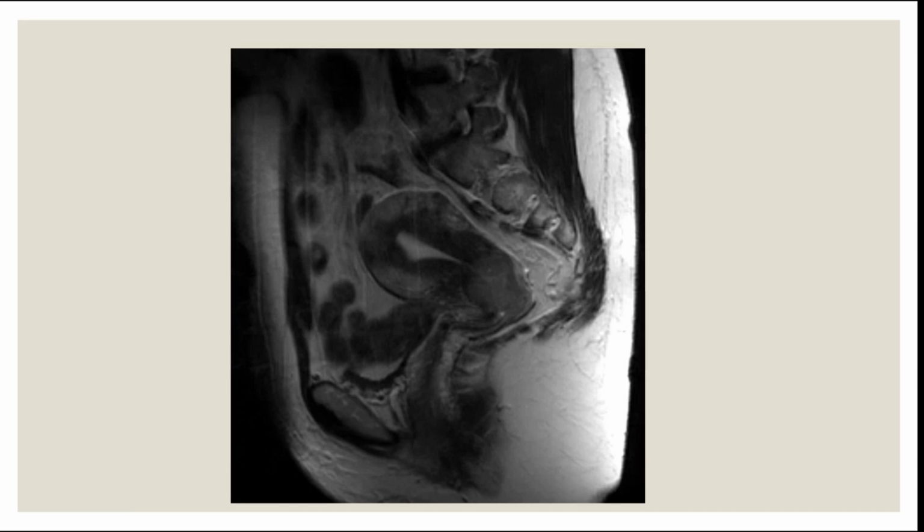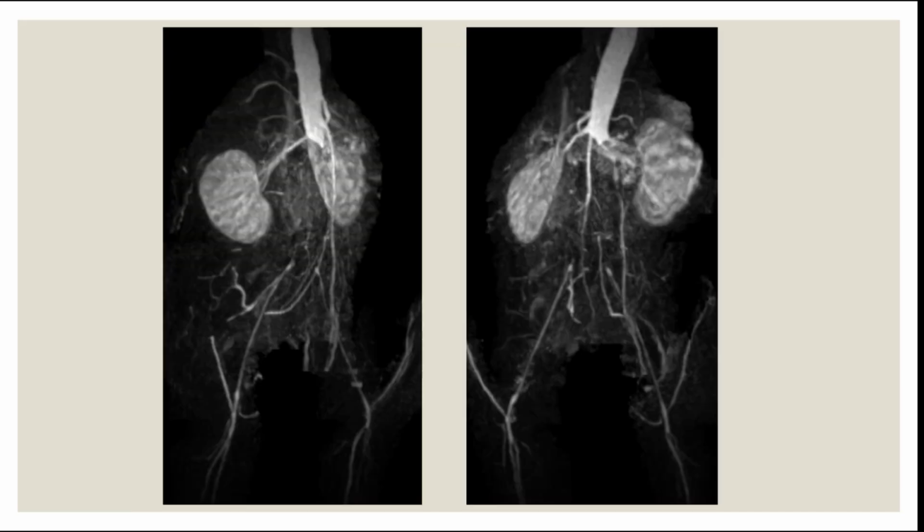I know MRIs are sometimes a bit difficult compared to the rest. So how about this one? This is a bit easier. Yes, okay, thank you. Again, this is MR. Go ahead, guys, don't worry about it.